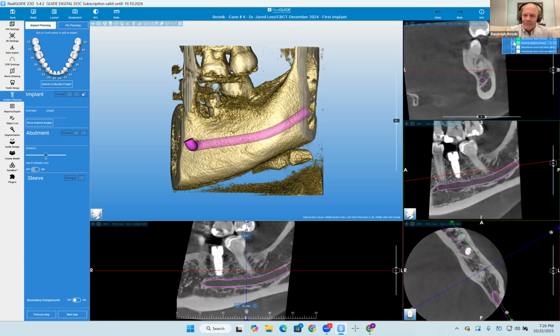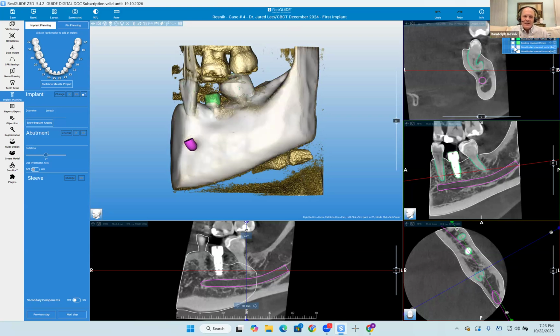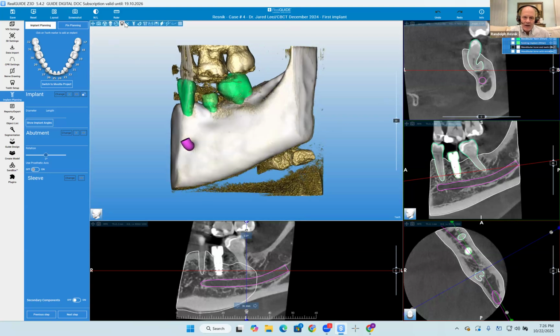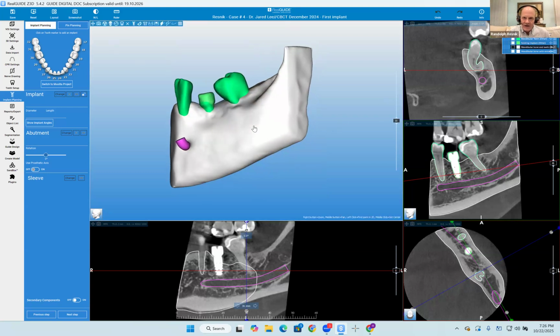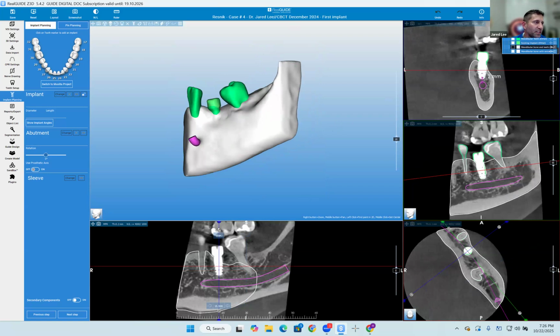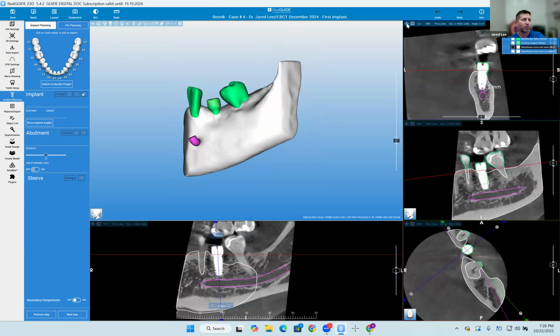Hey, so, good. Dr. Hussein just gave me a good history here. So he said you placed an implant a couple years ago, which is the scan right here. Yeah, so fully guided. Okay, and we took the post-op CBCT. So I have a before where we planned it. I have an after we placed it.